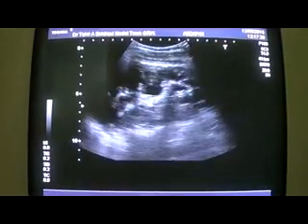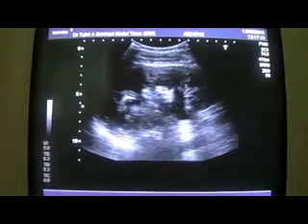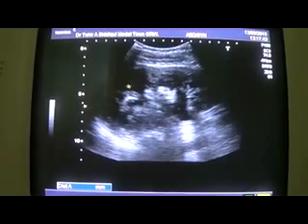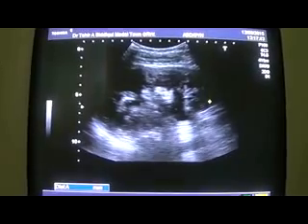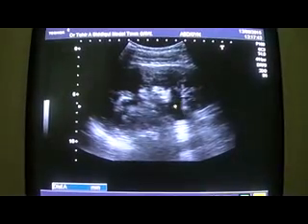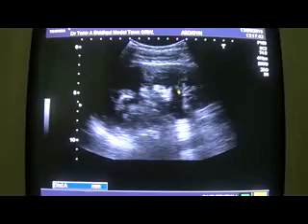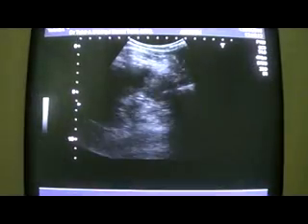Second thing to note is that you are seeing cystic areas all over, from lower to the upper pole. These are the upper pole dilated calyces. This is the upper pole dilated calyx, mid-region dilated calyx, lower pole dilated calyx. This is the pelvis of the kidney, and we can see the central sinus echogenic complex fat as well in the mid-region only in this patient.